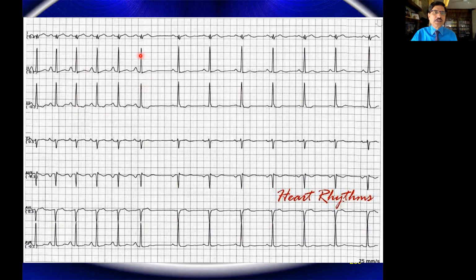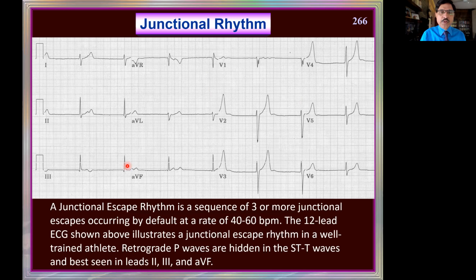But the only thing is, this looks like a sinus tachycardia. If I don't show you this part and only show the left part, it looks like sinus tachycardia only. But immediately I see that it is paroxysmal, then I know it is sinoatrial reentry tachycardia, also called SART, S-A-R-T. Now, there are two or three more that are important for us, and we will do them and stop.